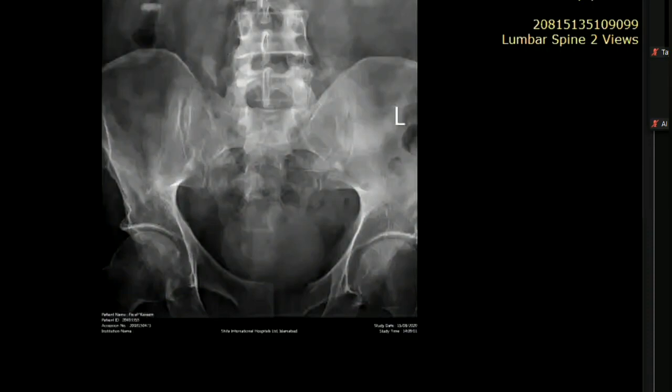Keeping in view this pelvic region mass along with pubic bone abnormality, I'm considering it is in the anterior half of the pelvis. Maybe some mass lesion that is eroding the bone, or maybe a large lesion that is causing pressure effects on the bone. I would like to see a CT scan of this patient, preferably a contrast enhanced CT scan.